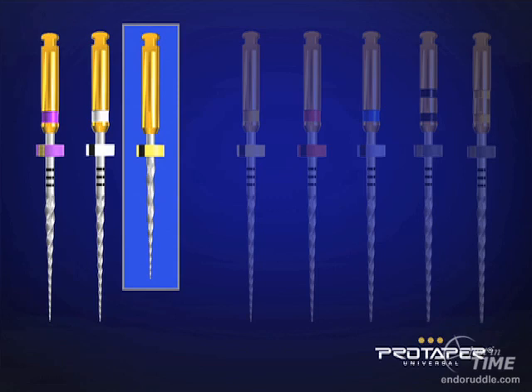triangles of dentin. The second application of Shaper X is to help you treat and get a full shape in the body of the canal on anatomically short teeth or in badly broken down teeth. Let me make a critical distinction.